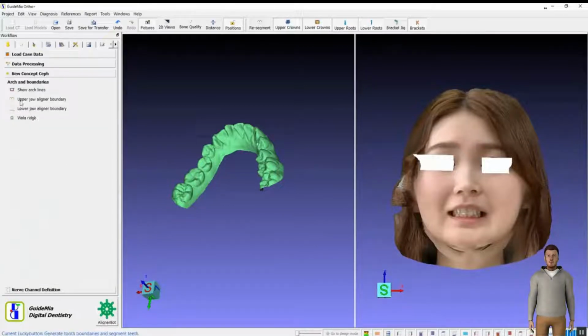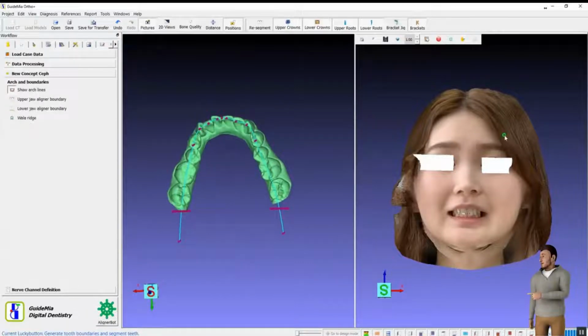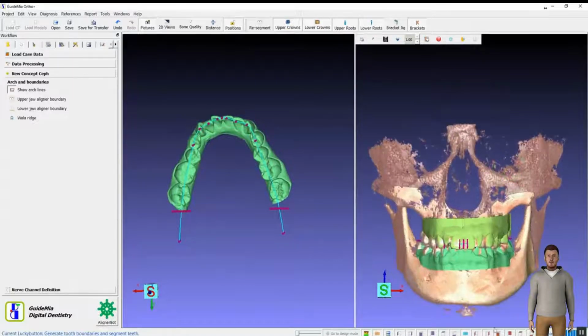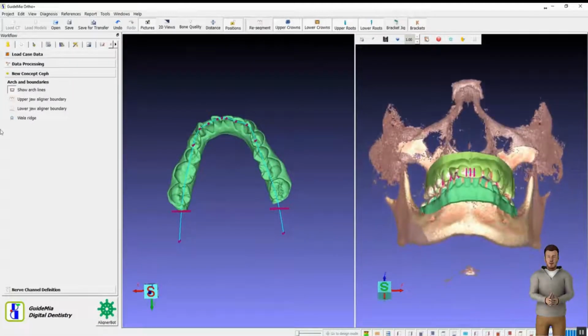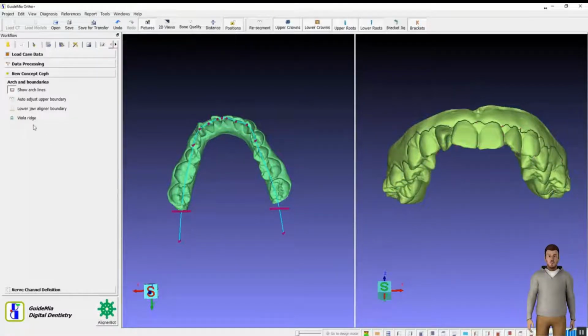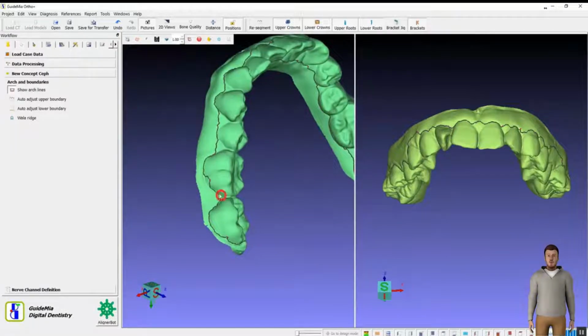After the fixing, we further investigate the tooth orientations and adjust them. Use the middle mouse button to select and show the orientation widget. Rotate the view, so we can see a tooth from the occlusal side, and then rotate the bounding box to align with the tooth and view orientation. This way, we can fix the tooth orientations, going one by one. After this, we can check the FA curves on the buccal side. Then we switch to the lower jaw, perform segmentation, and follow the fixing steps in the same process.